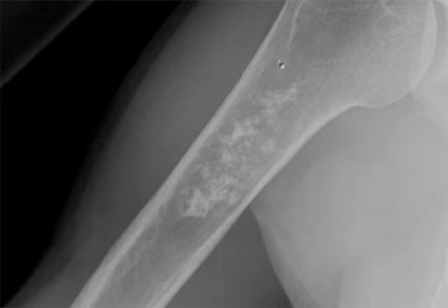We can identify that this is predominantly a sclerotic or radiodense lesion located here. So it's located in the diaphysis of the humerus, perhaps abutting the metaphysis. It's also located centrally within the medullary cavity, as opposed to being eccentric or along the cortical margins. There is a matrix within this lesion, and that matrix is a radiodense or calcific appearing matrix. Sometimes people describe this as a C's and O's appearance.